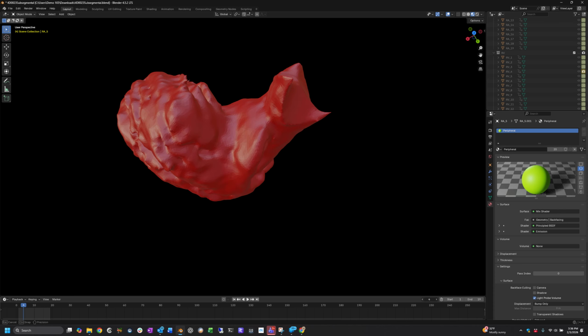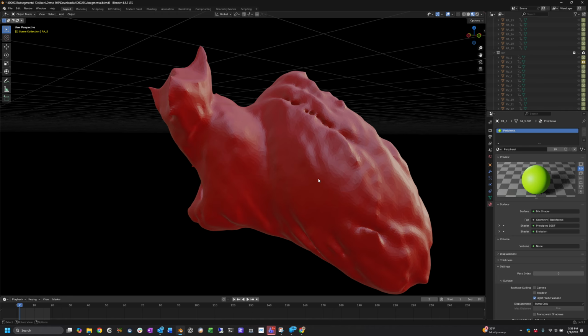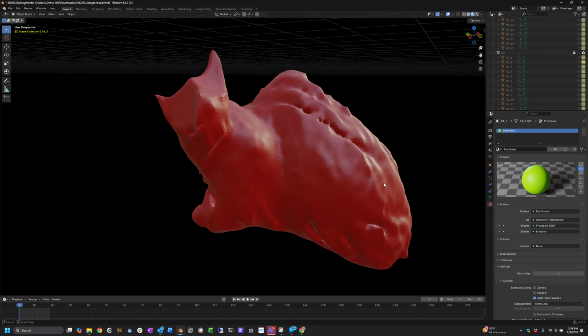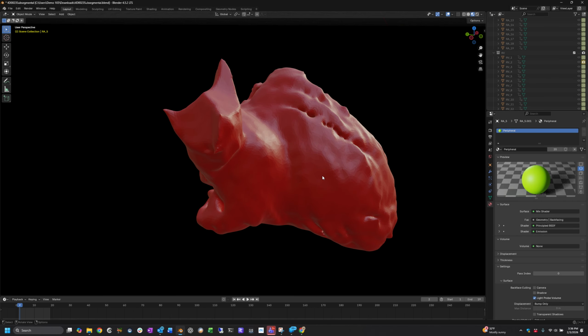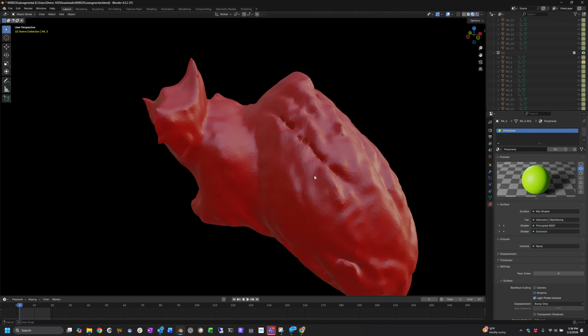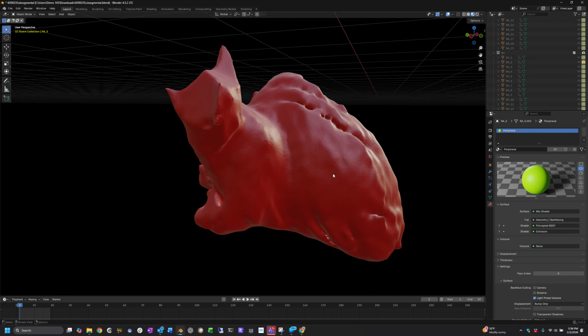So for the purposes of, let's first discuss, we're going to apply the method to this. I would choose one of these that looks pretty good as your starting point. Pick a starting point where you like the mitral and you like the aorta, and see how it looks starting in end systole and then finding a good one in end diastole, and see how those look.